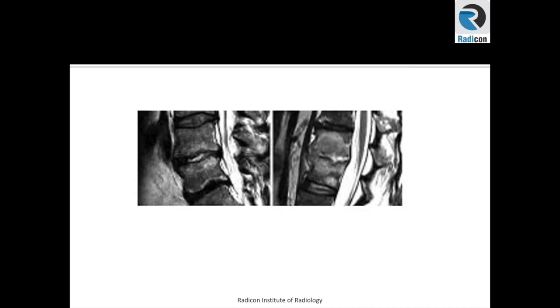We can have a look at their sagittal T2 weighted images. Both demonstrate high disc T2 weighted signal. We know that to call it discitis, we ideally want to see higher T2 signal in the disc equal to the CSF space, which is seen on both these cases.